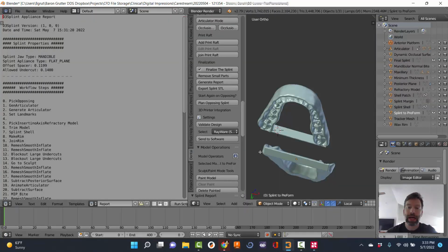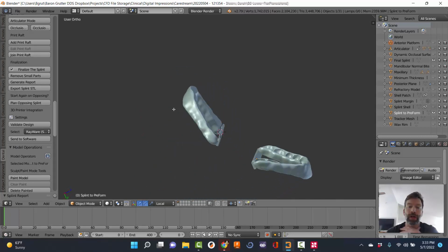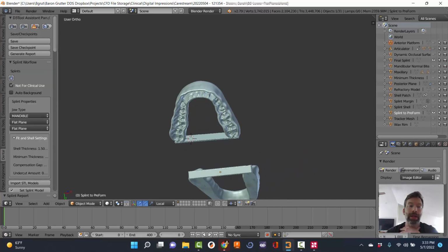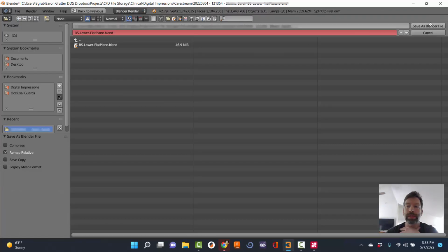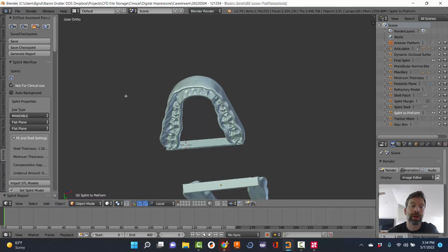Okay, well, I think I have covered all the newest, latest, and greatest updates of the software. If you want to hide this view, by the way, because it can be a little annoying, click here where these little 3 lines are and drag that way, and it goes away. All right, so I hope that covers everything. Make sure at the end you go right back up and hit save, because, well, saving's always smart. You can save it as a new one if you want to, to be able to go back and change, check whatever. Let's just see if I click auto background.